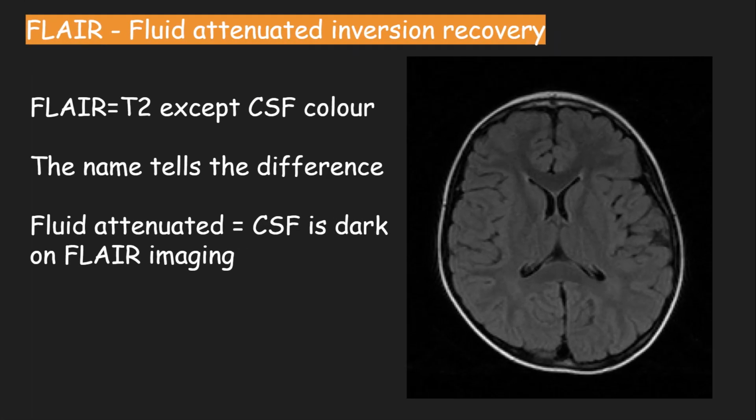Okay, what FLAIR stands for is Fluid Attenuated Inversion Recovery. To recognize this sequence, all you need to know is that it is similar to T2, and what the A stands for in the name will help you to remember that CSF is attenuated, or dark.